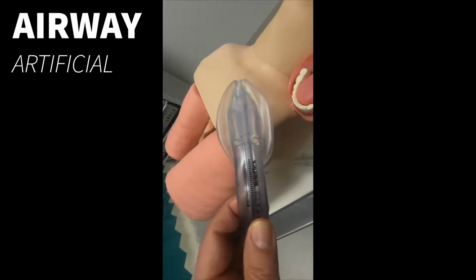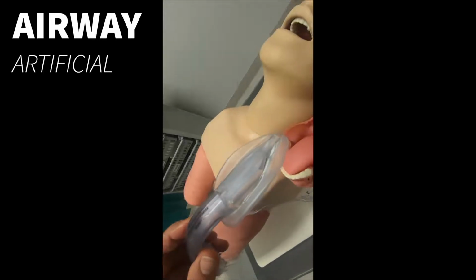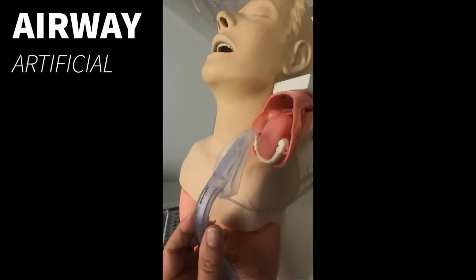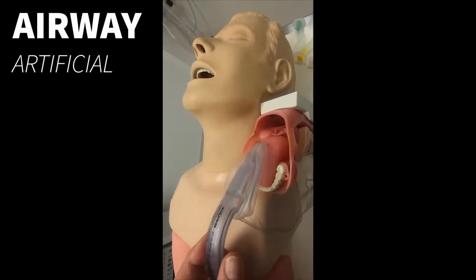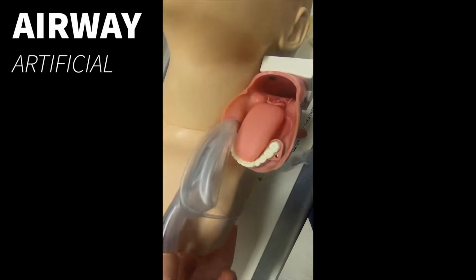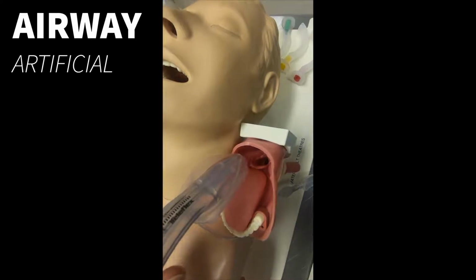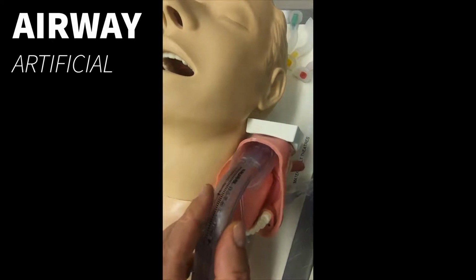To prepare it, you need to deflate this cuff. And then you'll see this in the movie as well. The tongue is your big enemy, so you either have to go towards the side of the tongue or over the palate, and then place the tip in the esophagus.